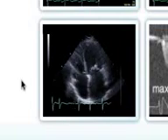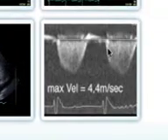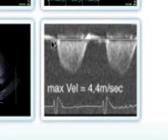Here's a patient with a very large atrium, again mitral stenosis, and also an enlarged right atrium. Take a look also at the shape of the atrium. It's more round, and we have a bulging of the interatrial septum to the right. We talked about that already when we talked about the heart chambers. This means that we have an elevation of left atrial pressure. And finally, this is from a patient who has mitral stenosis. We see that this patient also has pulmonary hypertension, very severe pulmonary hypertension with a velocity of over 4 meters per second.